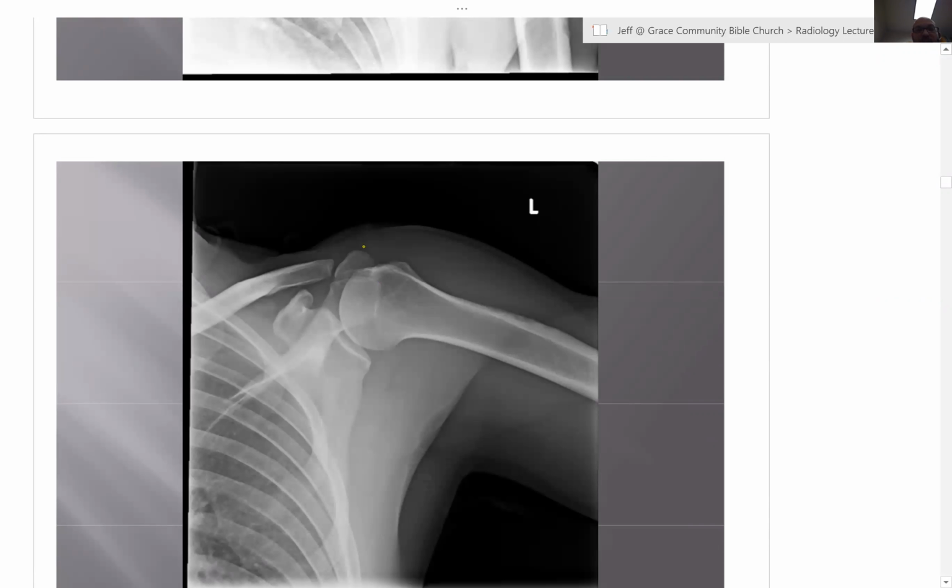In the acromion, if you look at it, notice that it looks like it's actually split right in 2. Isn't that strange on the baby arm view? That's why it looked indistinct. And it's got well-defined margins, so it's got to be chronic. It can't be a new thing. It's got to be an old process.